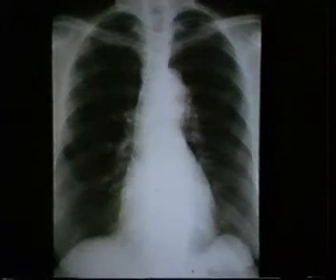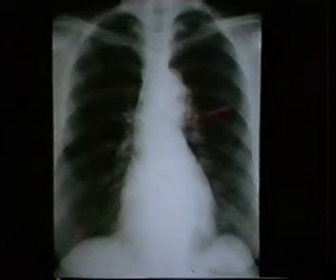So a couple of illustrations. We have a lesion here overlapping the aortopulmonary window, although not really silhouetting anything. Pretty big lesion on the lateral. It's kind of surprising that this is the only abnormality visible on the PA, although I think people were likely to be suspicious in this case no matter what, because it is a patient with myasthenia gravis, and this is proven to represent a thymoma.